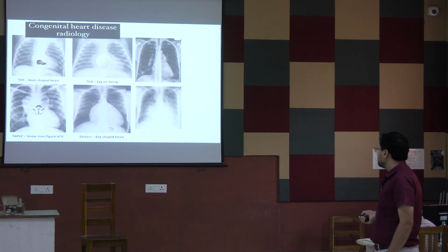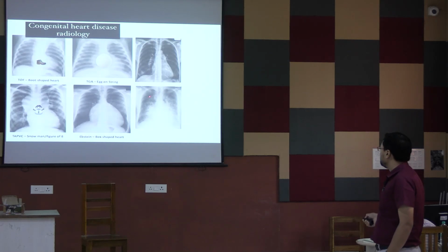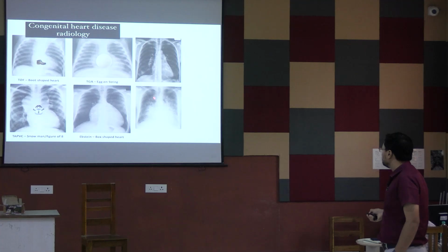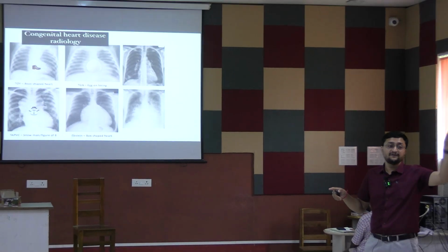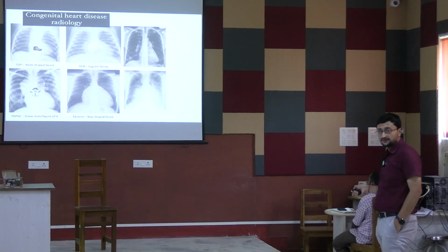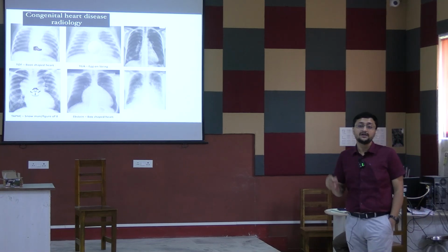First, the cardiothoracic ratio is increased definitely, and there are opacities around both hilum, both hilar areas are congested. এই যে যেগুলো hilar area গুলো আছে সেগুলো তো congested, but this congestion is not spread to the periphery of the chest. Periphery of the chest is almost clear. The opacities are just around the hilum. So this is called Batwing appearance or typically pulmonary edema. So this is very important.